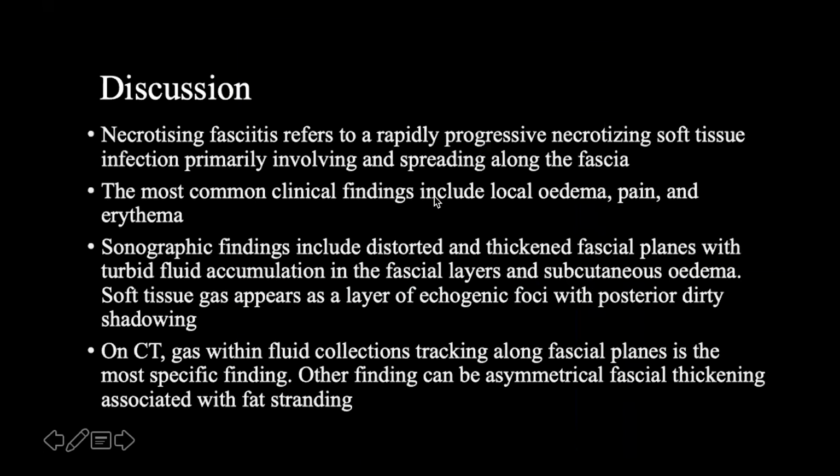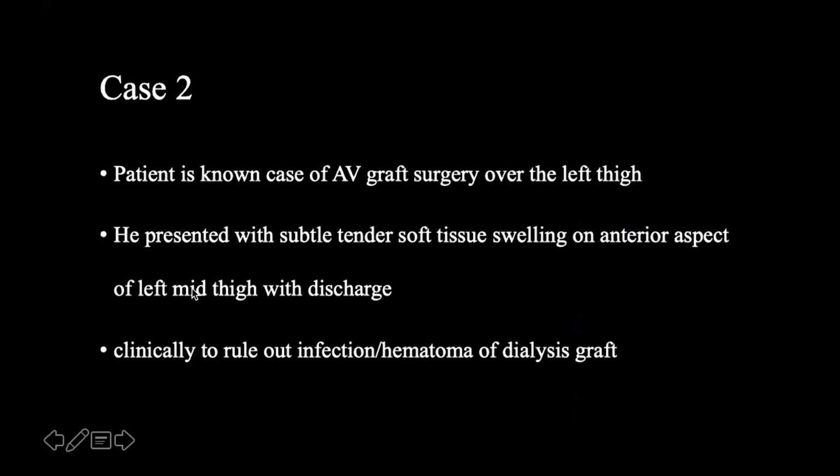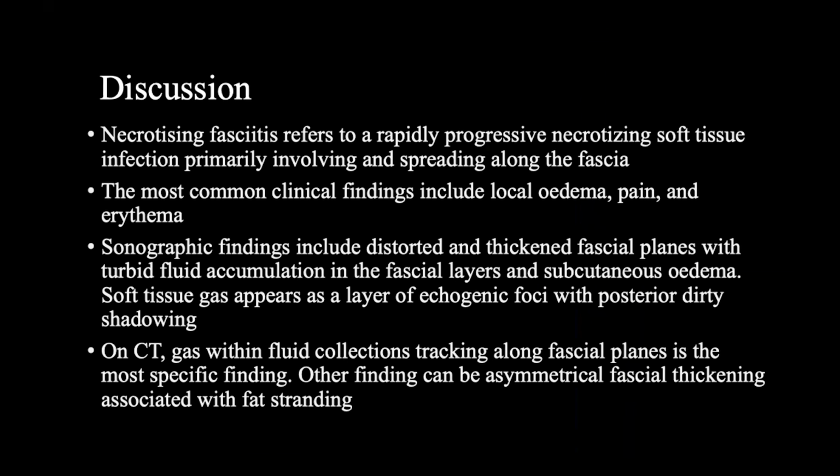So basically necrotizing fasciitis is a rare entity, and it is a fulminant necrotizing infection of the soft tissue. Ultrasound helps us in clinching the diagnosis with thickening of the fascia. And as soon as I saw the gas, this was really worrisome. So the patient could be treated.